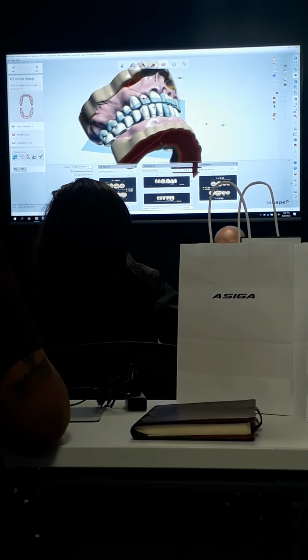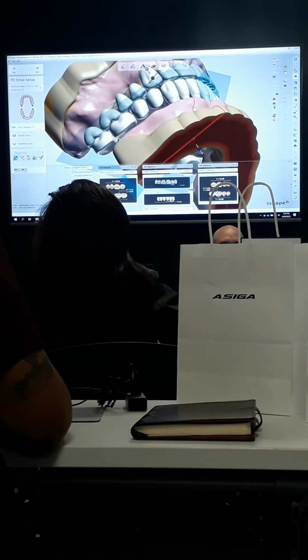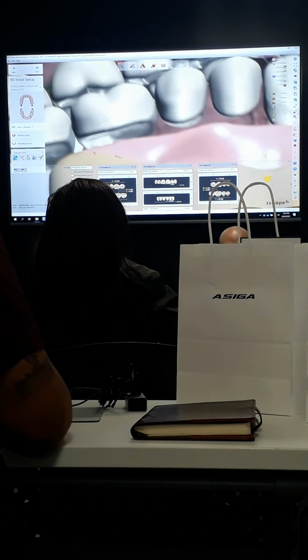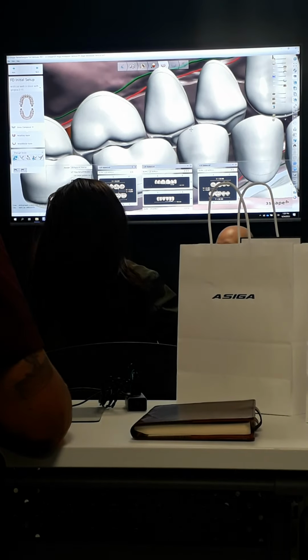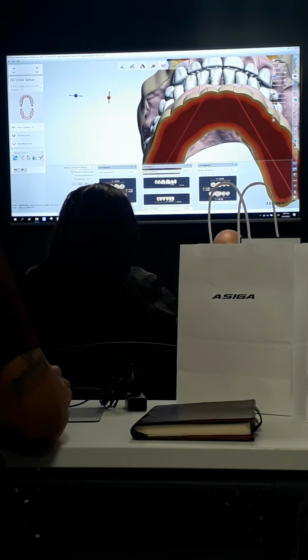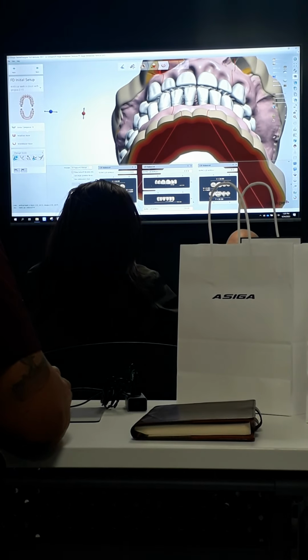So I can see my library here. And one of the things I want you all to see when I look at this, see how it's already in a balanced occlusal setup without me doing anything. I haven't changed the setup at all, I've just applied it. One of the things I always recommend when you look at the libraries is try not to change too much of the posterior, because you're going to mess up the balanced occlusion that the library came in on.